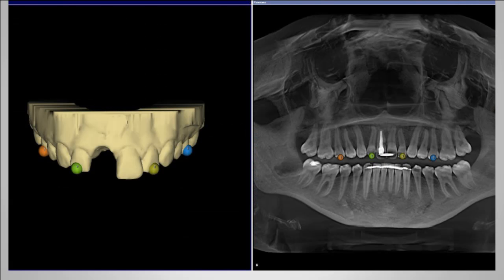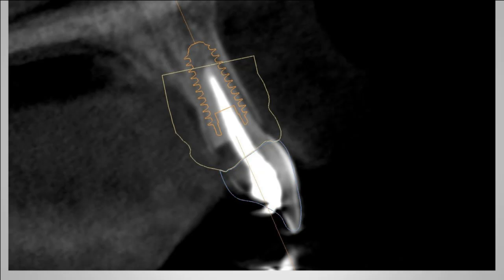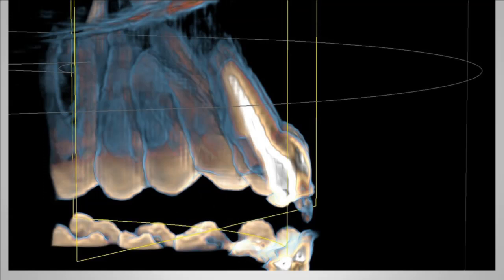The cone beam that would be required for CEREC data would be either the XG3D, the Orthophos SL, or the Galileos from Sirona. Combining these together allows the clinician to actually see an optical impression of the soft tissue, the virtual tooth that we're replacing, and plan for an appropriate implant. As you see here, we've planned for an AnyRidge implant for immediate placement. The concept was designed so that we can deliver a screw-retained restoration as well.